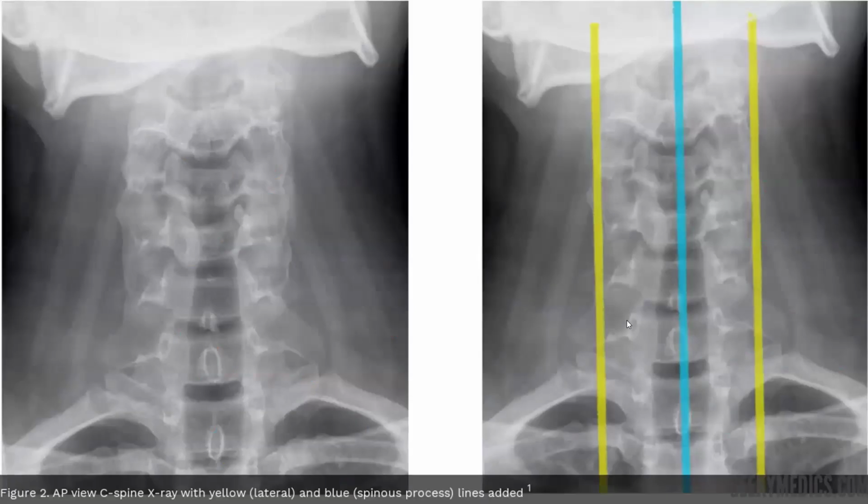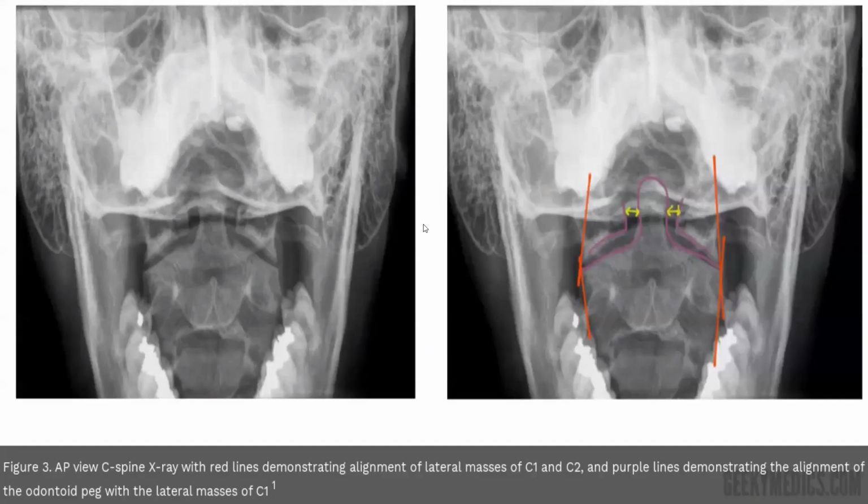They can ask you, what is this line? What is this view? Swimmer. Odontoid, open mouth view. So, odontoid view, open mouth view.